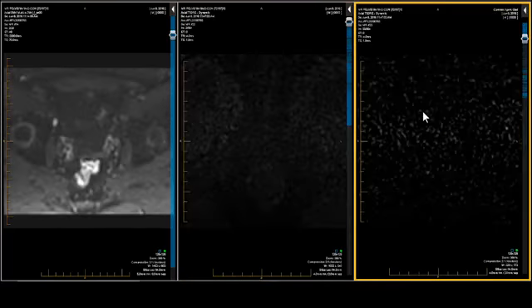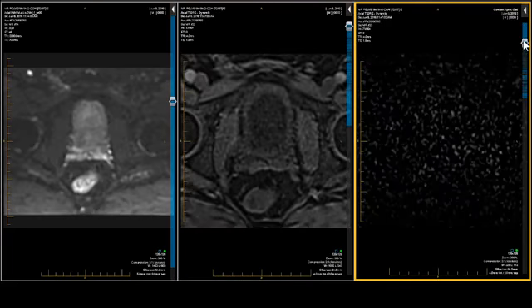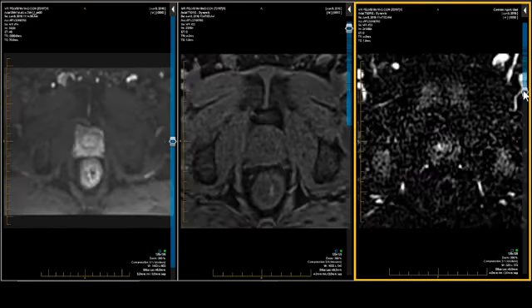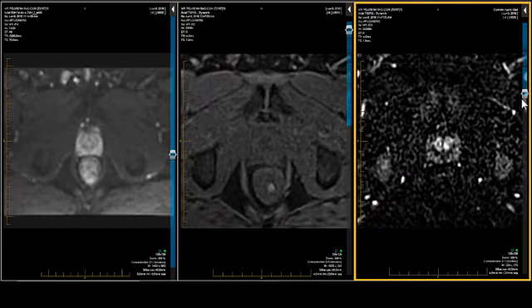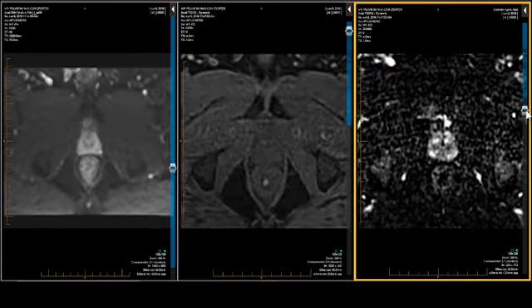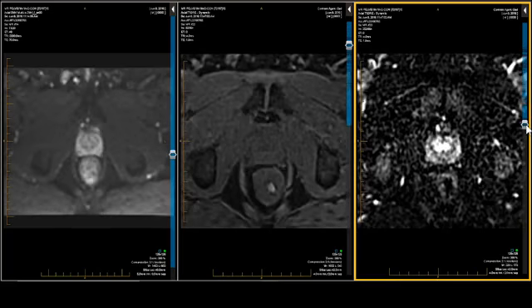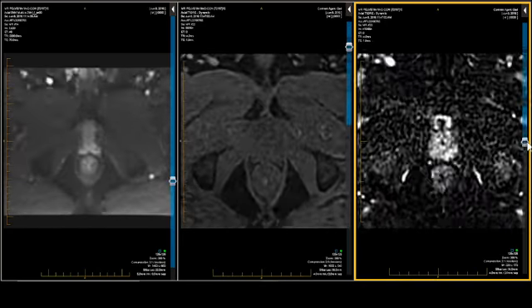You can also subtract this information, which is what was done on the right. Let's look at the subtraction. You'll see that central periurethral enhancement right there. And you'll see it get brighter. The rest of the gland starts to catch up, and brighter and brighter.